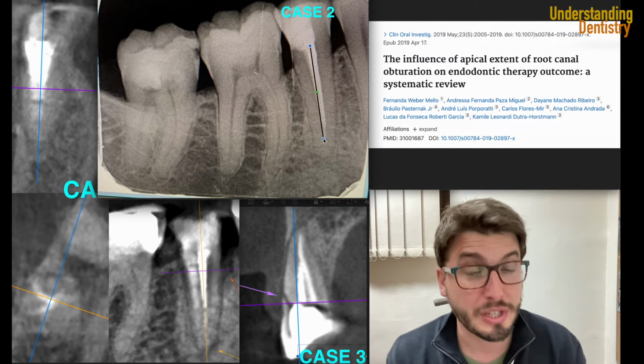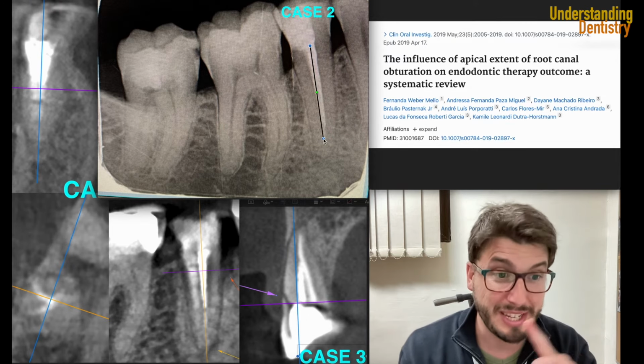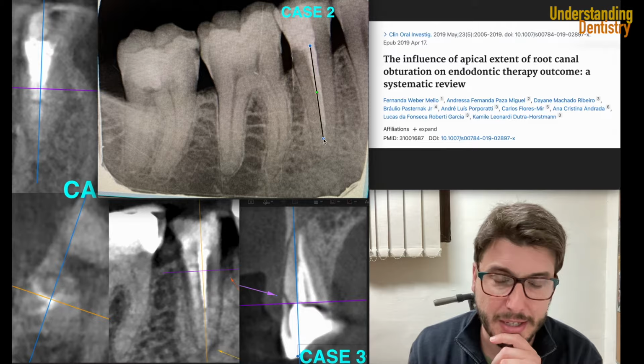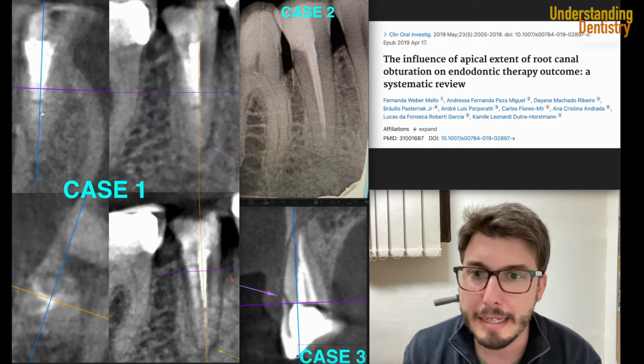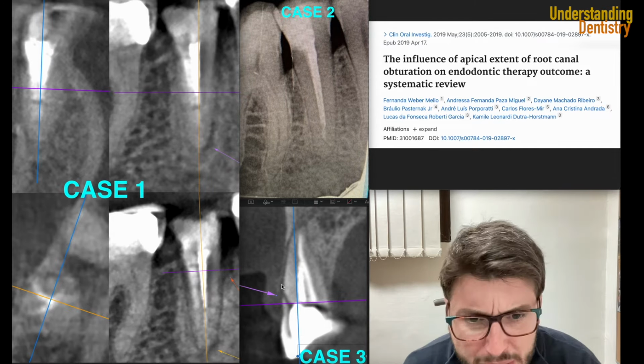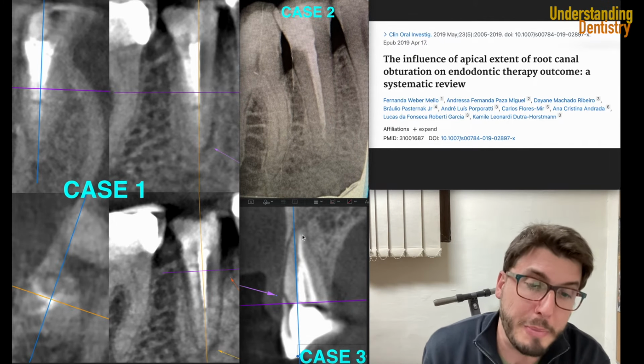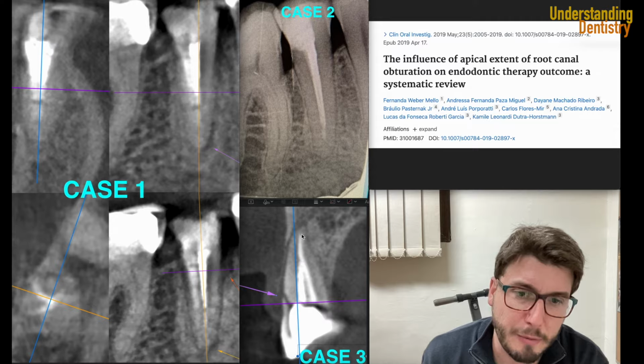And then those cases, usually you have the lesions. So that's a very nice clinical tip, okay? Not only based in scientific information, but also in clinical experience. Let's see the other case here, and then we have here a root canal treatment, which is not even, you know, maybe a little bit underextended, but it's almost at the level of the apex.